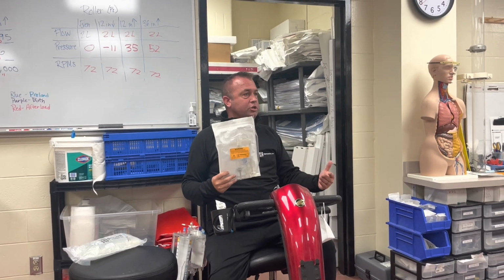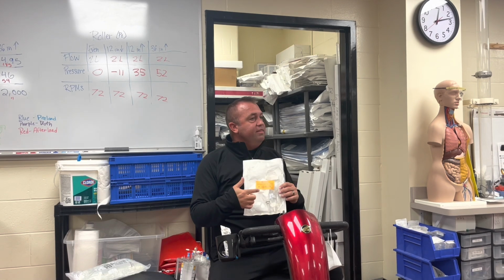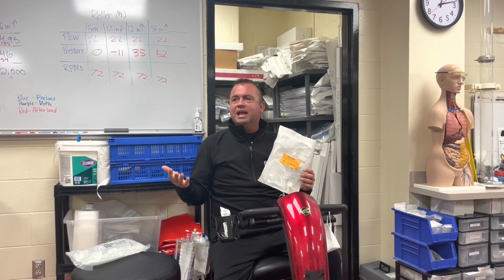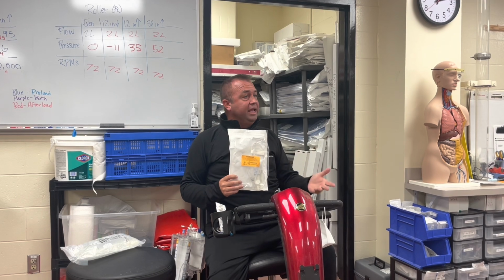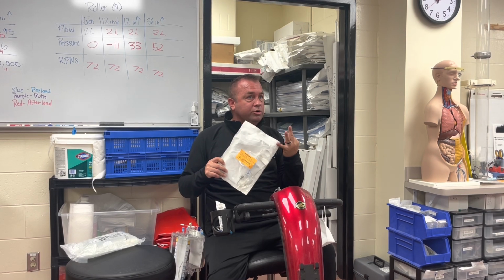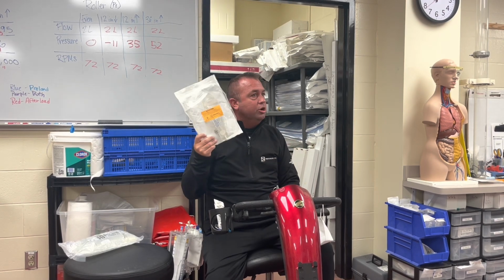The same thing goes with a patient in surgery. This is a single transducer, and we're going to open this up in a minute. These come in single, double, or triple transducers. All that is a simple way of deciding how many pressures you want to measure. So if we have a Swan-Ganz catheter in, we're going to automatically need how many pressures? 3, right? We're going to measure our arterial pressure, our CVP, and our PA pressure right off that.